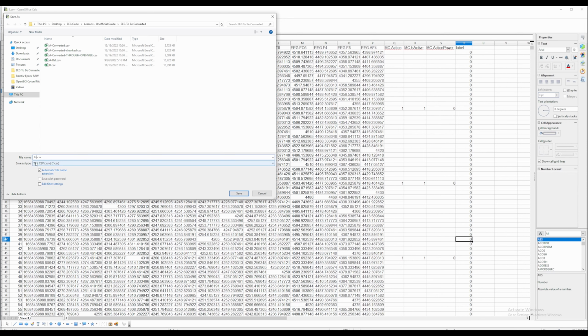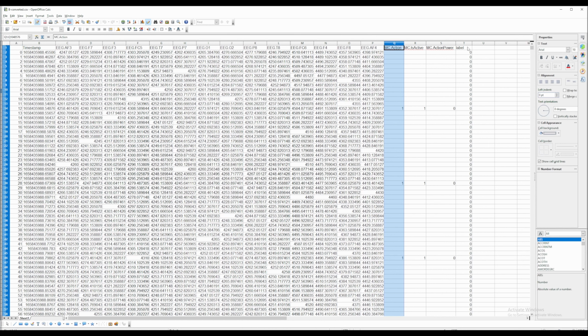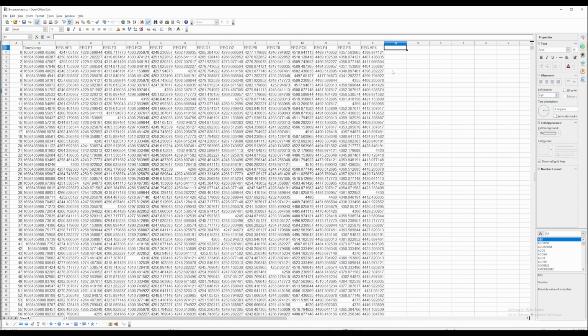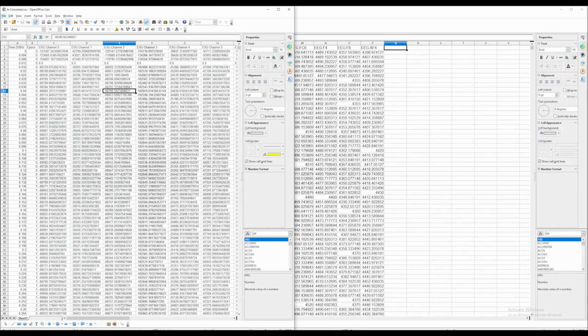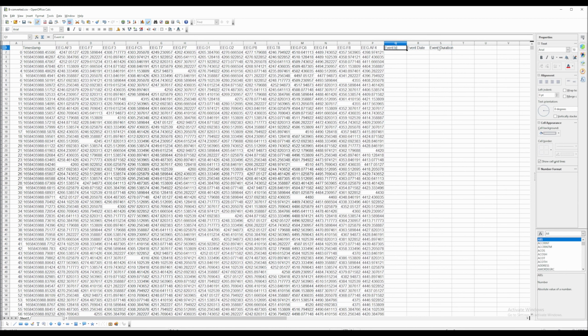CSV, so it'll be... and again, we only need the signal channels, but I'm just going to actually make use of the timestamp and index channel that's left here for us. So first I get rid of these columns. And we can paste our header back. These 3 columns have to be these. And these are the names from Emotiv Epoc X's electrode location.